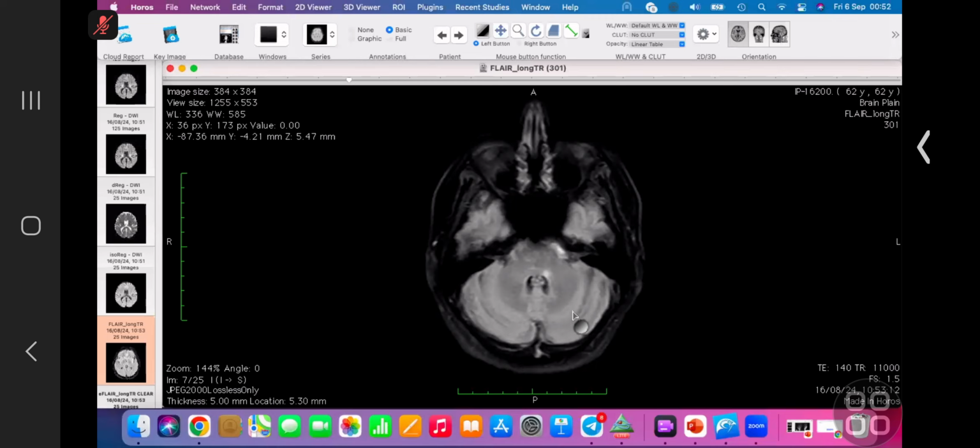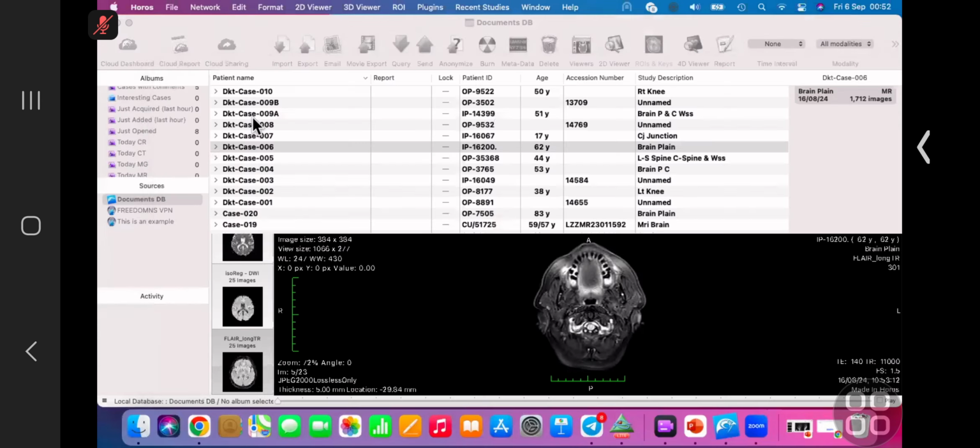So it's a facial collicular syndrome. So please read about it. And in the exam, localizing it precisely will definitely fetch you very good marks or higher marks. So remember that. And you should be very thorough in localizing infarcts. So don't miss out on these syndromic infarcts. Okay, let me show you the next case. Next case is also a very interesting case.